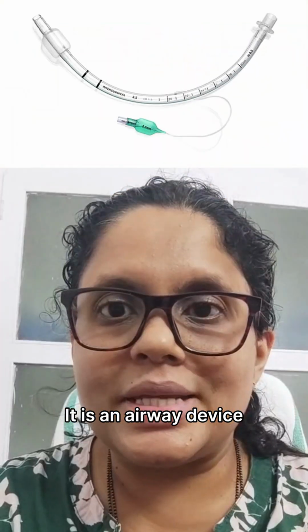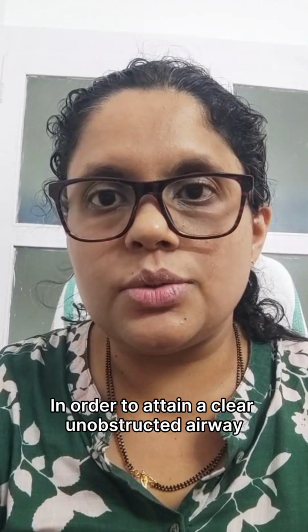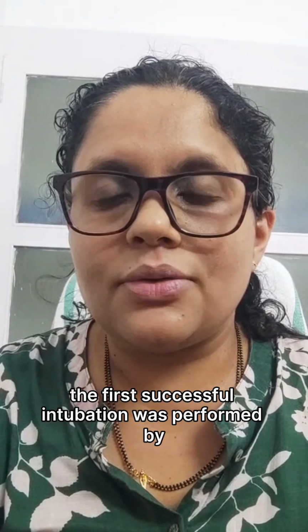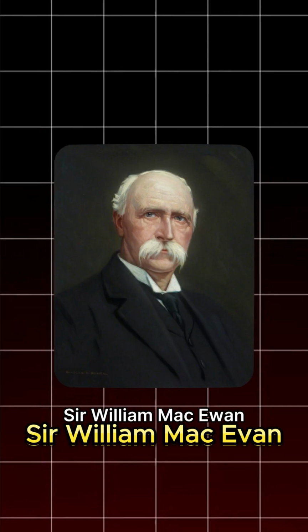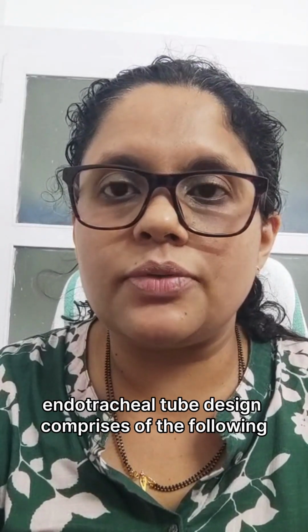Endotracheal tube is an airway device which is inserted via the larynx into the trachea in order to attain a clear, unobstructed airway for mechanical ventilation. The first successful intubation was performed by Sir William Macewen in 1878. A standard endotracheal tube design comprises the following.